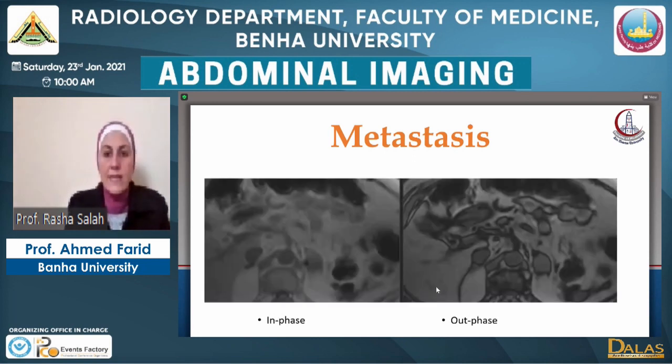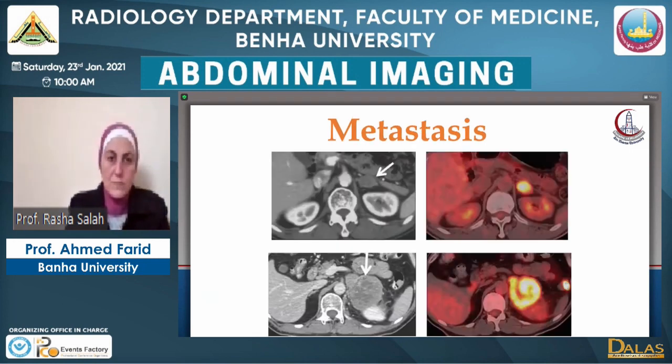Here are the in-phase and out-of-phase images for the left suprarenal mass. We can see that the signal is intermediate on the in-phase image, and the signal appears nearly stationary on the out-of-phase image. And notice the India ink sign at the periphery of the lesion. Then this means that there is no fat content inside this lesion, and this raises the possibility of a malignant left suprarenal mass, and in a setting of a known primary, this is considered metastatic till proved otherwise.